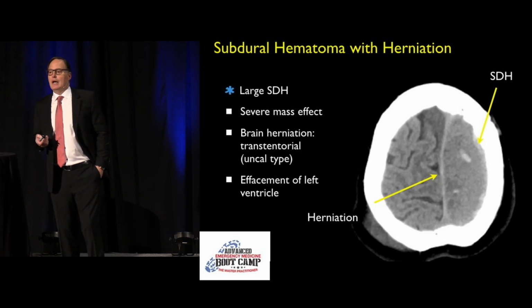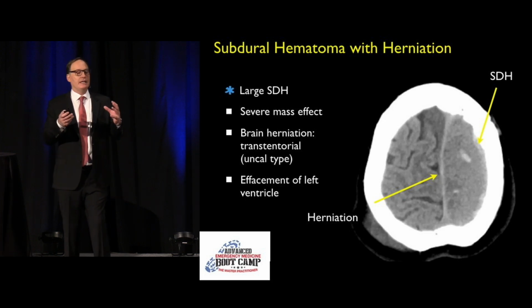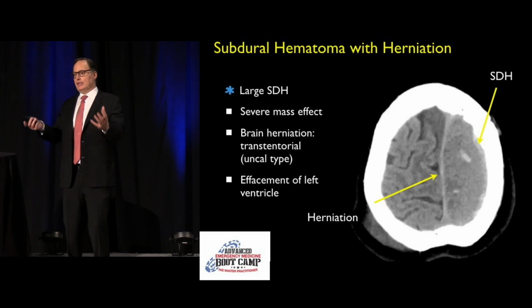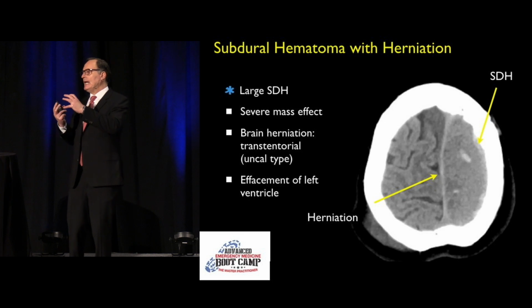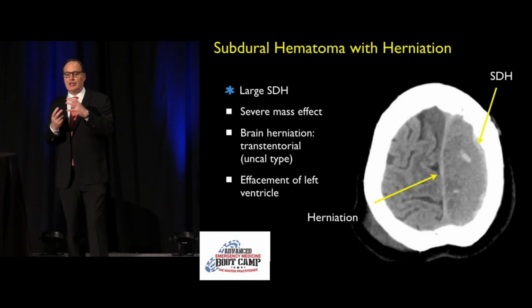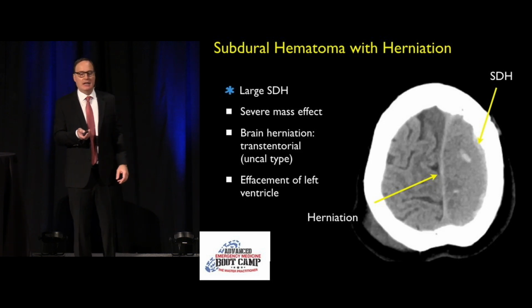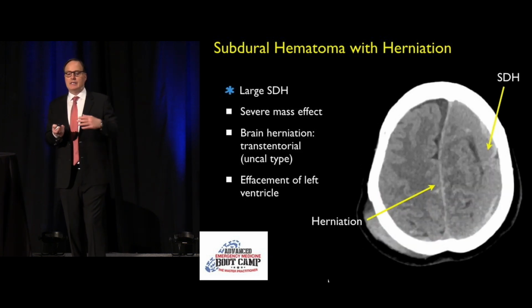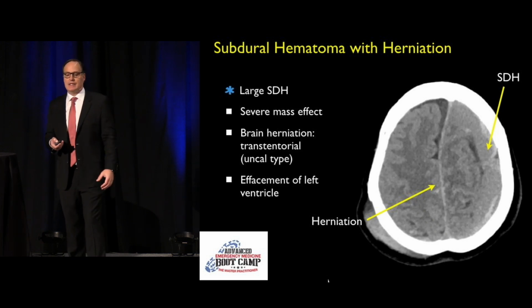Okay. This is just a sequence that I wanted to go over with you guys, just starting at the top. On the very top of the vertex on the axial cuts, notice that we don't see a similarity between the two sides. Okay. The hemivertexes look different. So the left side looks more tight than the right side. I see gyri. I see some fluid on the right side, but on the left side it looks really tight, and it looks like there might be a bleed up there as well, right? You can see that little bright area. As we go further down, notice that, again, it looks kind of tight up in there, very different than on the other side.